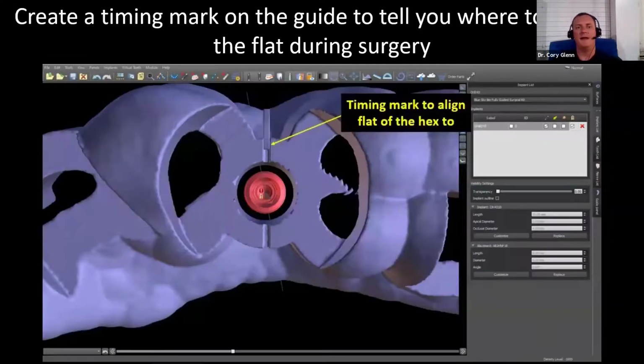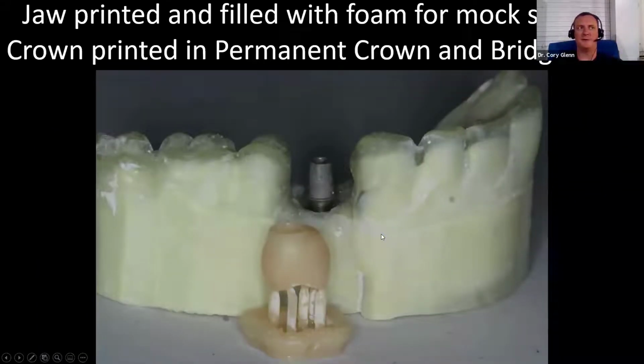And you can do that with the text emboss tool. I'll just turn the text emboss on and create a little I right on the guide, like the letter I, and that will create a timing mark. So again, when we go into surgery, the driver has 6 lines for each of your flats. Make sure you put a flat right to that line, and then everything should line up.